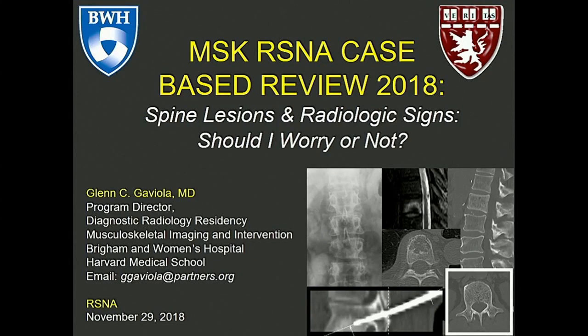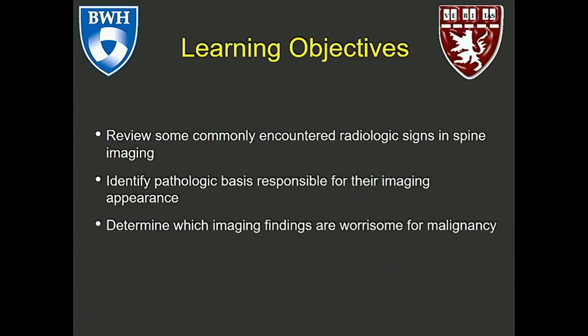Thank you, Dr. Smith. Good morning, everybody. So today we're going to be talking about spine lesions and in particular looking at radiologic signs. I know I spent a majority of my training really trying to figure out which things are worrisome and which things are not when we look at malignancy. And so we're going to focus the theme a little bit on this particular question of when should we worry or not when we see these radiologic signs.